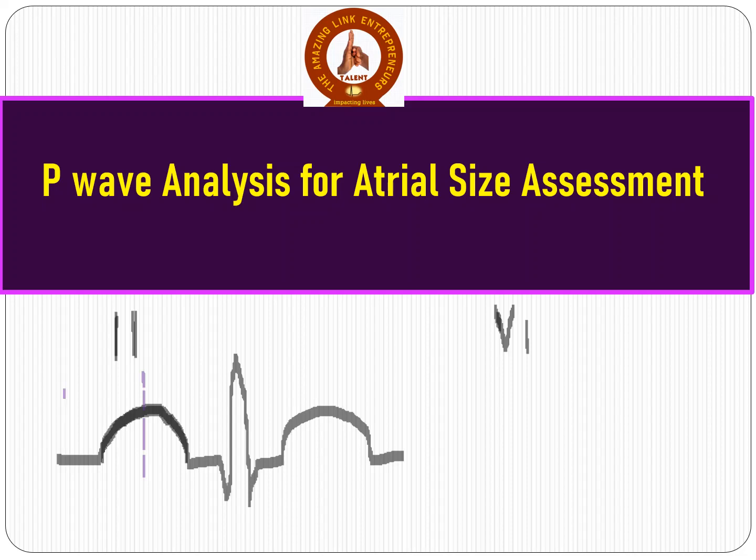The first component represents the right atrial depolarization. Whereas the second component, which is the latter component, represents the left atrial depolarization waveform.